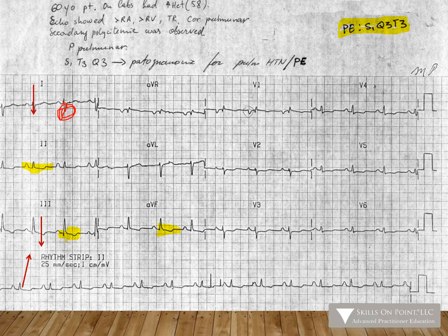Now, one other thing here that they've mentioned that I think is worth noting is that you have a flipped wave when you get into the V1 here. This is giving you a flipped P wave the other direction. Nothing to get too excited about, but sometimes you will see atrial enlargement too, and then the atrial enlargement will show up with an enlarged P wave, or sometimes you'll see a little double bump in there. It's called P mitral. However, not what we're seeing precisely here. This is probably a fairly acute thing, but some people do have this chronically. It gets worse and worse and worse, and they just have massive RVs. Just keep that in mind.